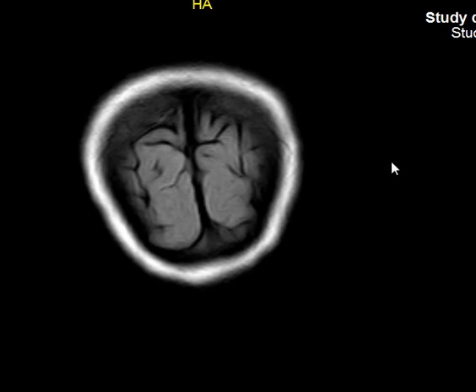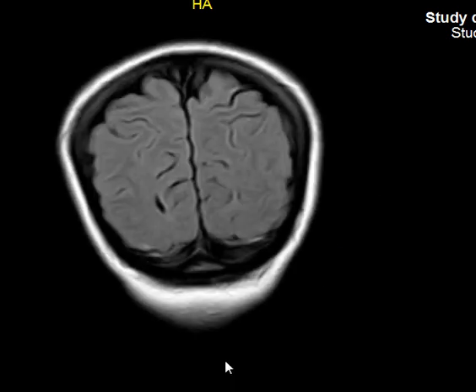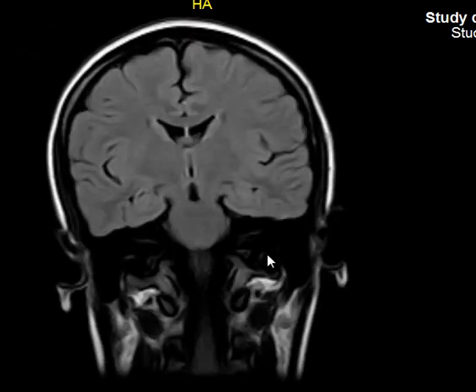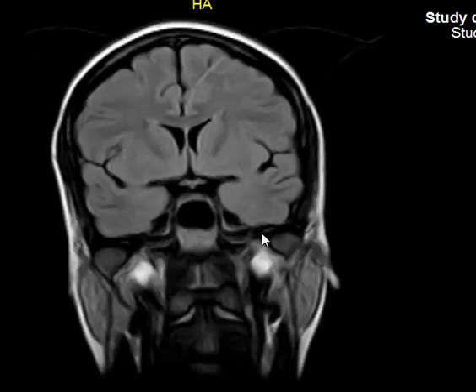You start the MRI by taking a quick look at the brain. First, I will try to make this as basic as possible, starting from scratch, from zero, and working our way up. First, you need to know that we have coronal, axial, and sagittal imaging planes in MRI or CT or whatever.